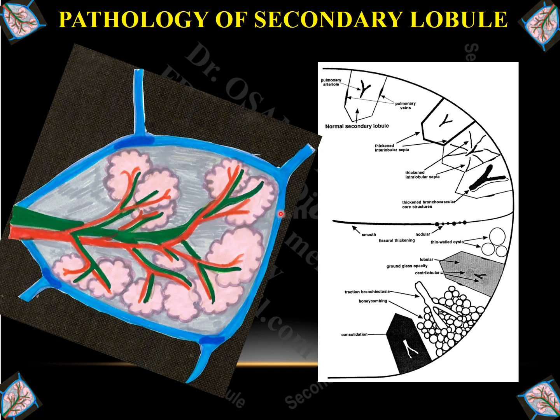If the alveolar walls distal to the terminal airways are destructed, it causes cystic structures in the center of the secondary pulmonary lobules, as we see here, cysts of centrilobular emphysema. If the secondary pulmonary lobules are opacified, these opacifications can be ground glass like this or consolidation like this. Give me a few seconds, I will differentiate between both of them in detail in the next slides.